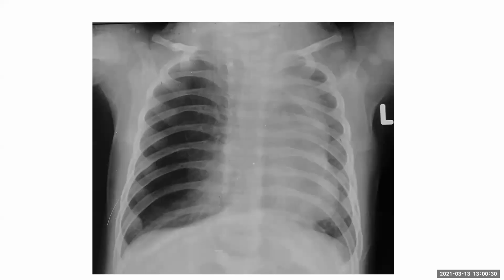Coming back to this X-ray, even if you can't appreciate this at first, because maybe you've not seen so many CLOs, the mediastinum is shifted towards the opposite side. You can see the anterior junctional line also shifted. You can see this hyperlucency in the right upper lung and mid lung, and the rest of the lung appears compressed.